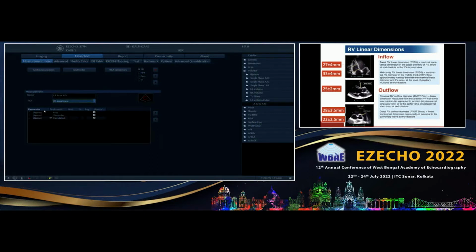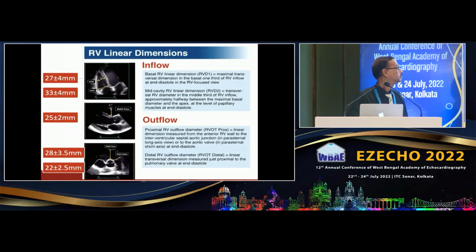Or in a patient with palpitations and so on, we generally just look at the MVP and LV, but rather look at the RVOT. If you see a biggish RVOT, immediately take those two measurements, because you may be catching an ARVC.